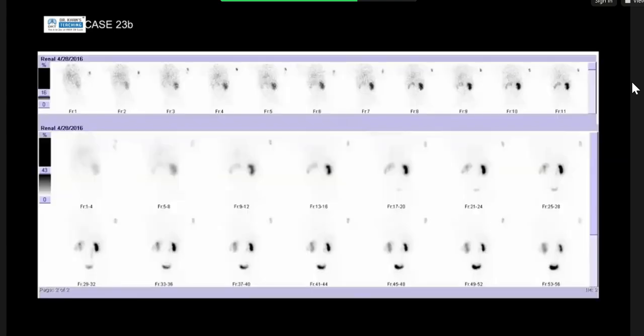Okay, so you keep saying contrast, but just to be pedantic for nuclear medicine, it's tracer uptake or radioisotope. It's not contrast. So just be mindful of that in the exam when you're presenting nuclear medicine studies. You can say tracer uptake, but not contrast. And you're completely correct. So the numbers here are time.